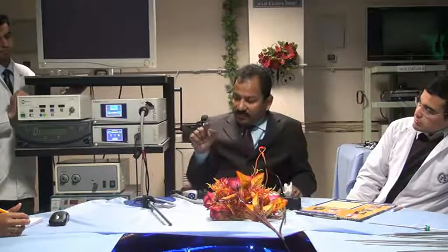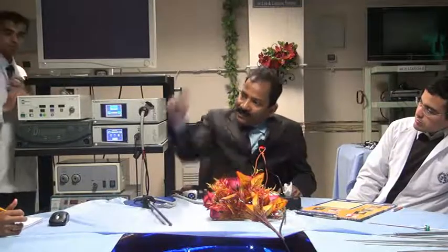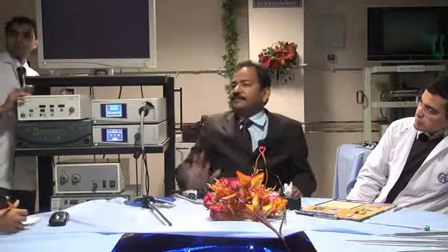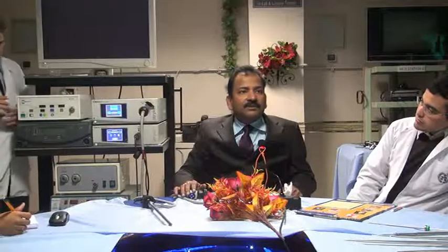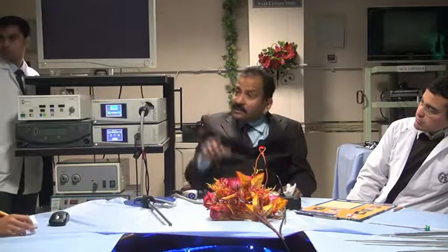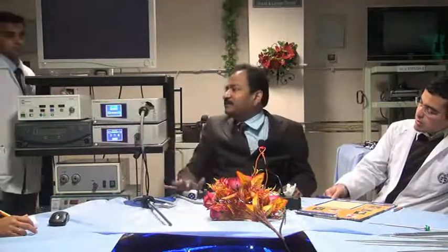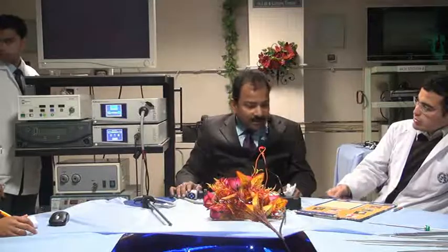So what the camera does in white balancing is, if there is any impurity, it will add a counter impurity to balance it. So it is actually not keeping everything at the same level, it is changing the level up or down. It is disturbing its own color to compensate for the impurities. It depends upon what impurity you have added.